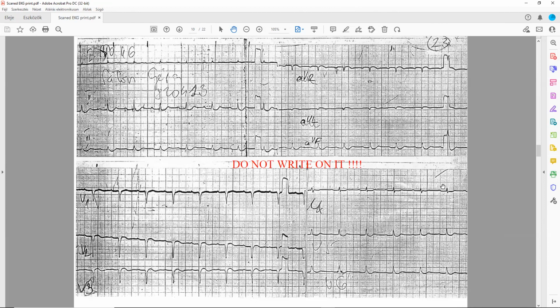Nisi, it's your turn. Sure. First of all, is it rhythmic or not? Rhythmic. Okay. Next one, heart rate: 1, 2, 3, like 3.5, almost 4. Let's make it 4. So that would be 75.